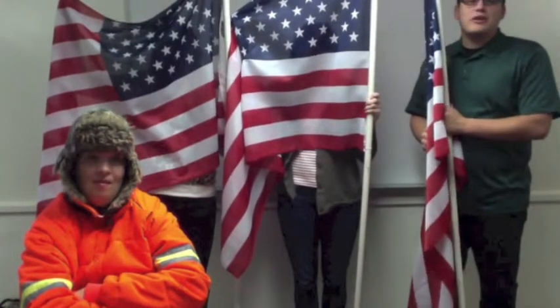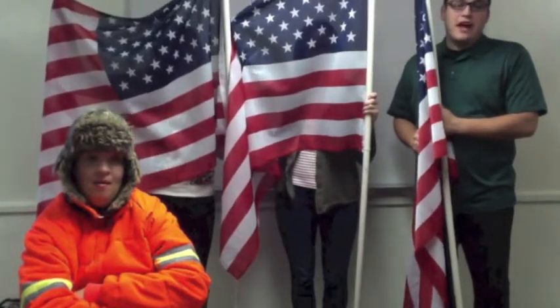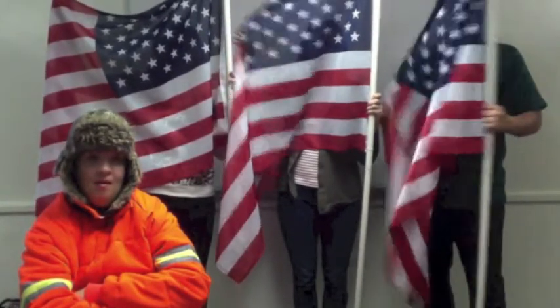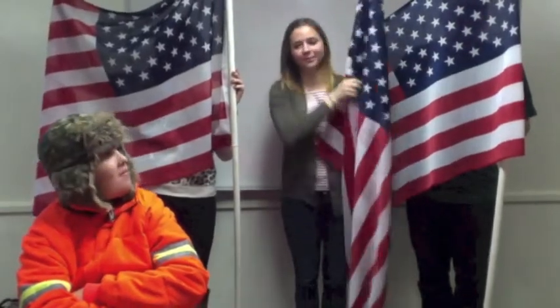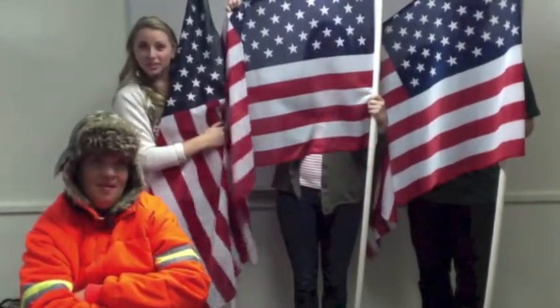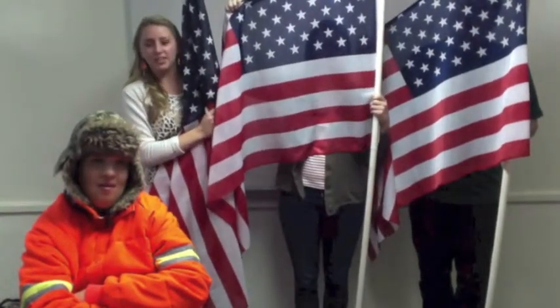Okay, so today's quick review for Sounding Board: it is free, which we all like. It is also available on the Android and Apple Store. You can use it with ELL students or students who are nonverbal. Last but not least, it is an AAC device, an augmentative and alternative communication device.